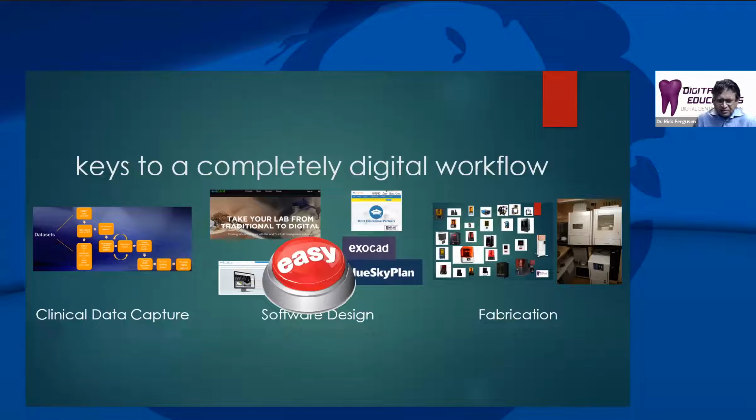The clinical capture is still relevant, of course, and I'll walk through some workflows, but the software and the automation that, again, companies like Blue Sky have put into their software has made it so much easier for us to take on this part of it or refer some of this out.